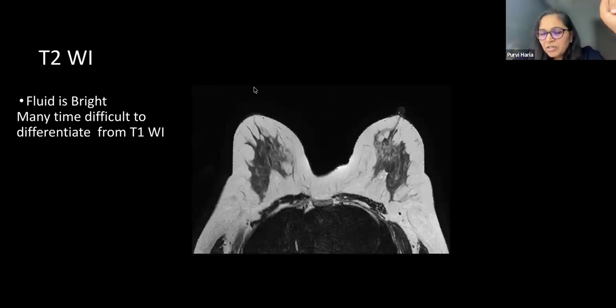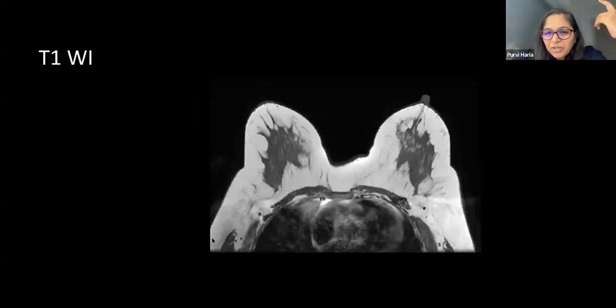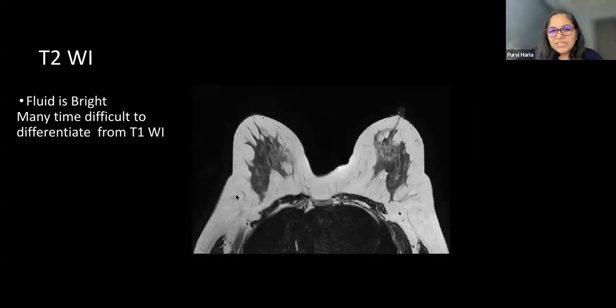So it is difficult to make out which is T1 and which is T2, and that is absolutely fine. For radiologists, there are the TR, TE values which are mentioned, with which we can make out which is T2 and T1. But whenever you can make out which is the T1 sequence and which is the T2 sequence, good; it is sometimes difficult, and if you cannot make out, it is fine. I'll tell you what we see on each sequence, but it is slightly difficult.